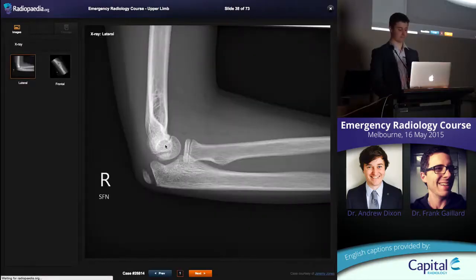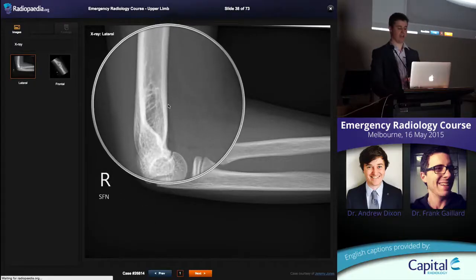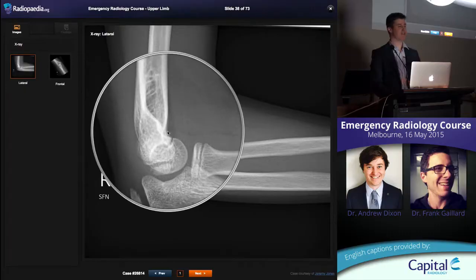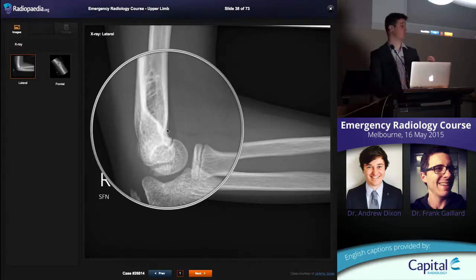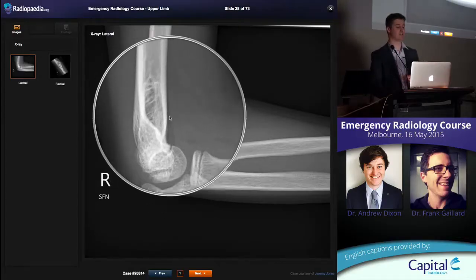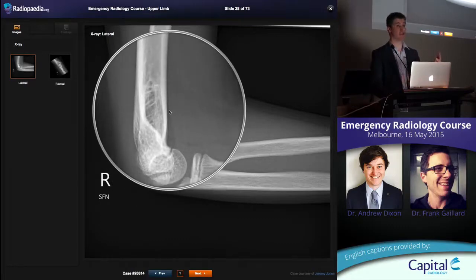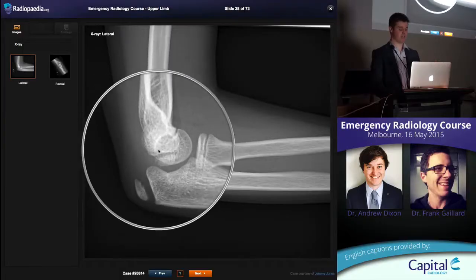Here's another patient. This one I think is normal. I just want to point out that you can often detect that anterior fat pad if you're not seeing any fluid density or soft tissue density behind it, pushing it forward, because that's what the actual effusion is, right? It's that fluid density behind it, pushing the fat forward. If you're not seeing any of that, then there's probably not a joint effusion. So here, you can actually see the anterior fat pad in the setting of normality, okay? We're not seeing the posterior fat pad at the back here.